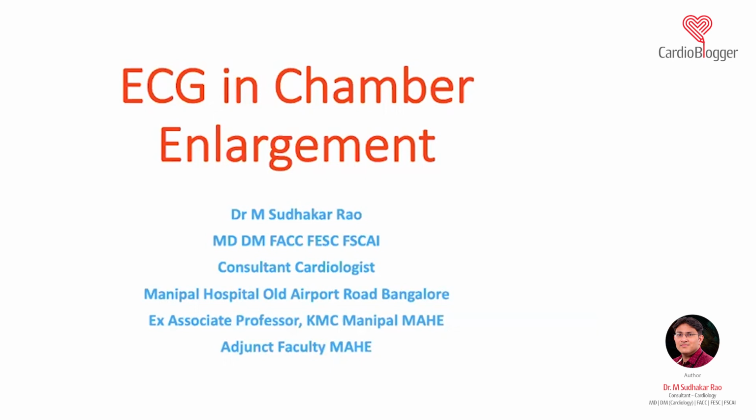So the important thing is that chamber enlargement is very important in the ECG, because when you diagnose a chamber enlargement, it invariably leads to many differentials which can cause it, and so you can narrow down your differential diagnosis. So with this thought in mind, we should focus on how to diagnose each chamber enlargement in the ECG. Now my talk will take you through images of many patients which we can discuss. So let's go through the first patient's ECG.